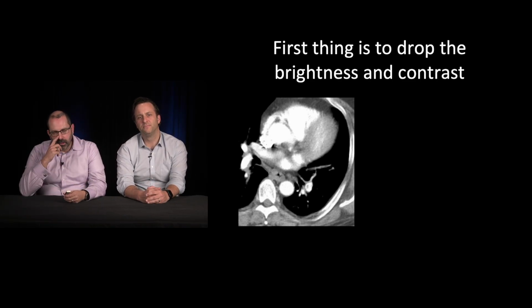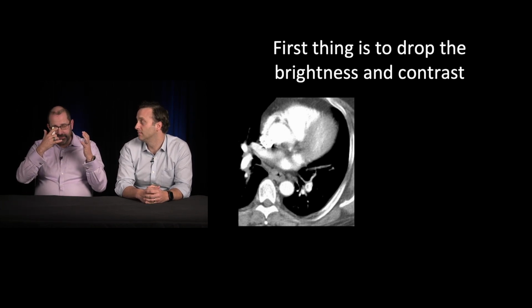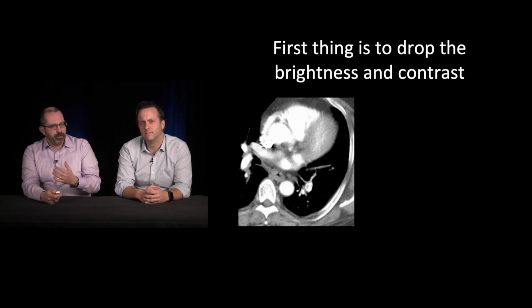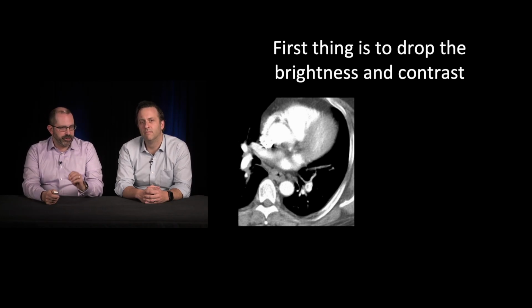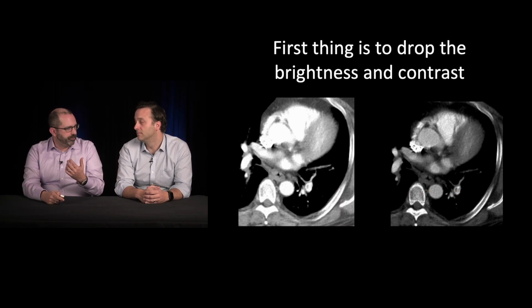Let's do it. So the first thing I do is I drop the brightness and the contrast down. Because when you open this, it's big, flashy, in your face, almost blinding, right? And what I find is that when you drop that brightness and contrast down, it makes it a lot easier to pick out filling defects. So here I drop it down a little bit, and you can see maybe a little hint of something over here, but a lot more obvious now that I drop that contrast down. So that's the first thing that I do.